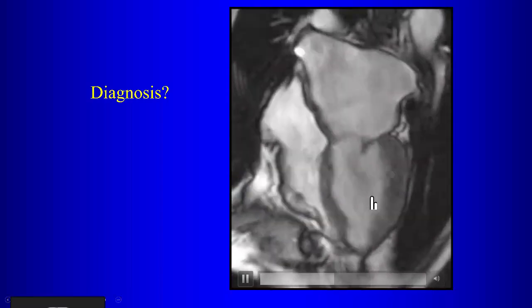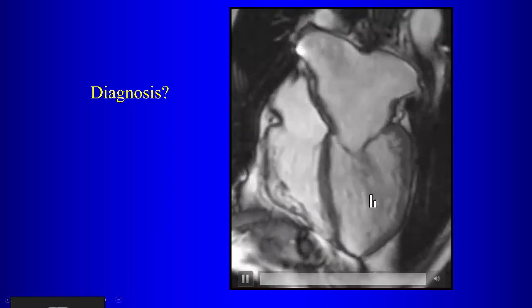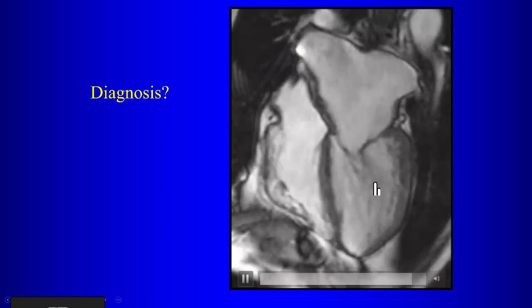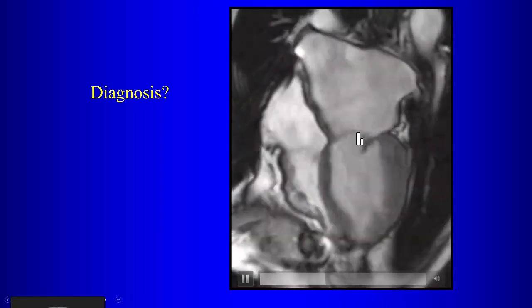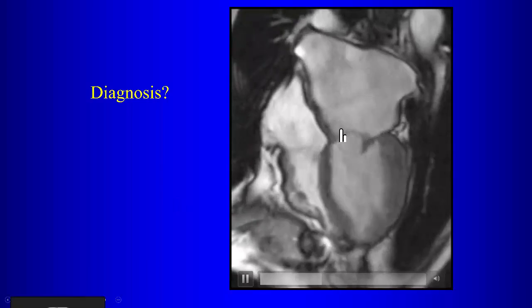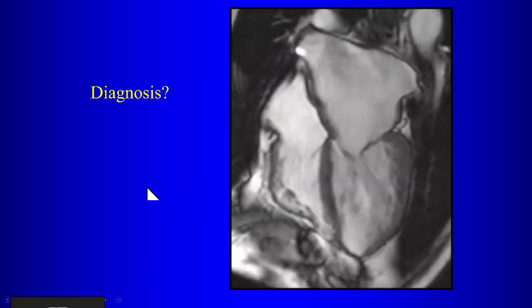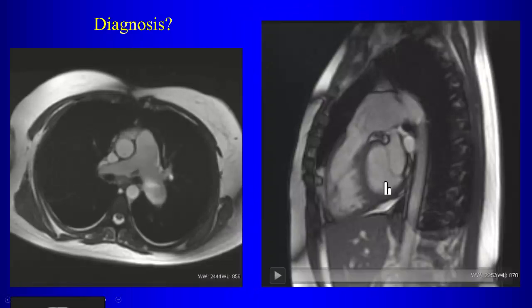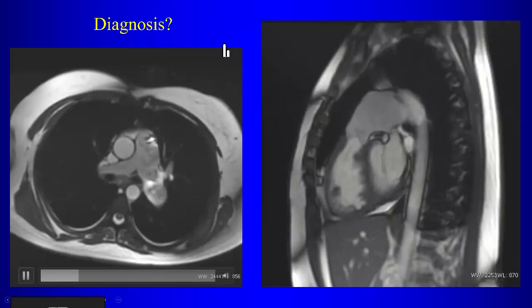You can see a little bit of the jet. Also in this case, there's another problem with the mitral valve. What is it? Prolapse again, right? You can see the prolapse. So there's also a little bit of mitral valve prolapse. But the main problem, there's not much regurg. We don't see regurg. So the problem here is mitral stenosis. Okay? What's wrong here?